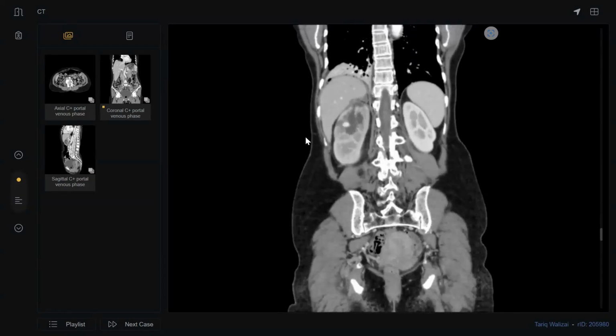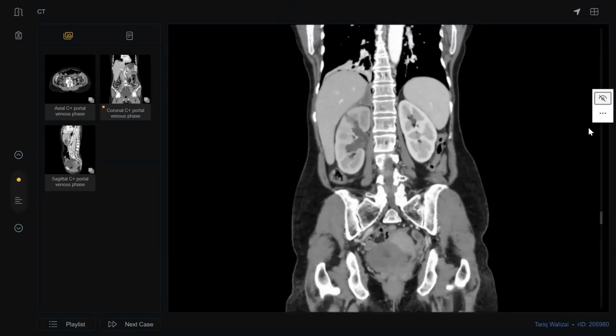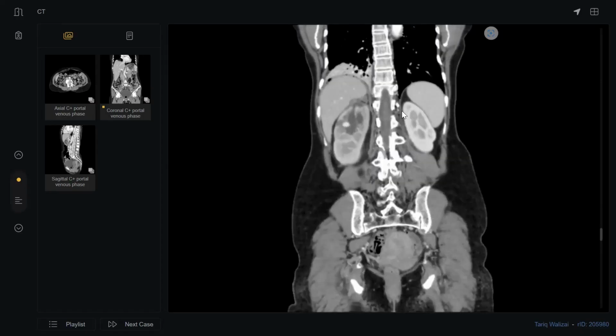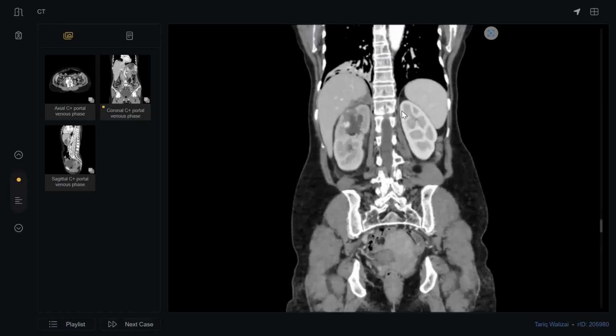Thank you, sir. My colleagues, many candidates will not tell you the full history because if I told him this is a trauma, I give him 50% of the diagnosis. Okay? Leave the mouse, please, doctor. What happened here? You find something localized only in one kidney, in one part, almost on the upper half. So think in localized causes.